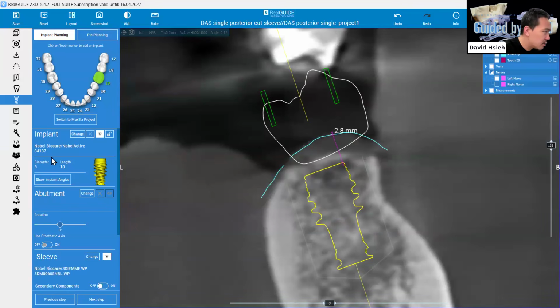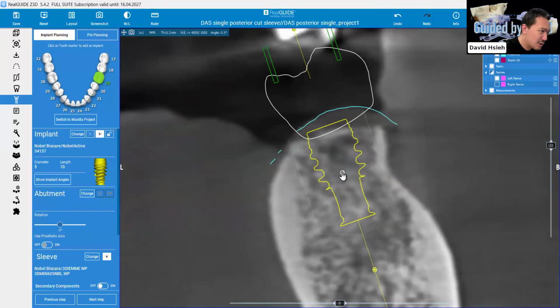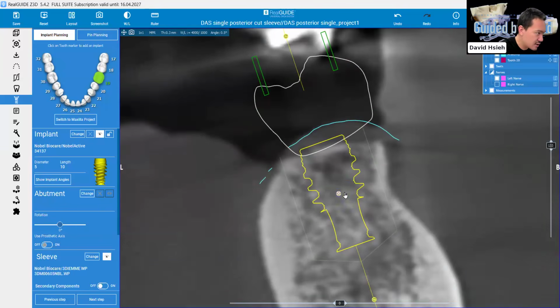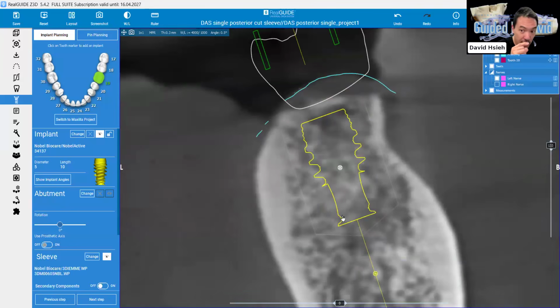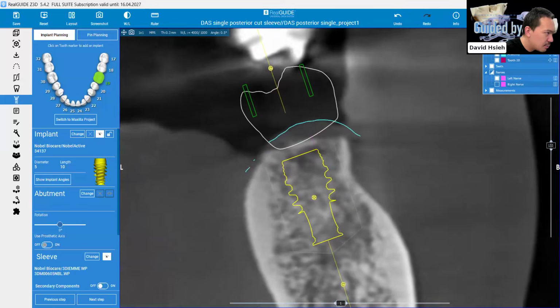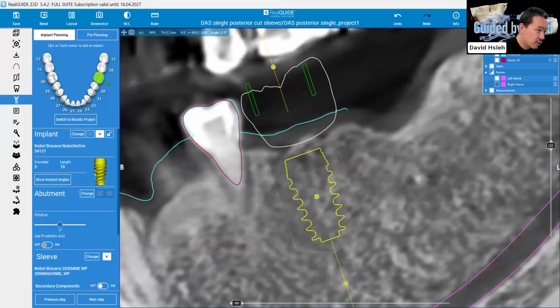For example, if the implant is too shallow, your crown might have a very sharp turn, like a shelf, right? That is not good for the emergence profile or the biological width, right? The connective tissue and the epithelium around it that could seal the implant and the abutment, right? So a proper depth of about 3 millimeters is a great depth for longevity.